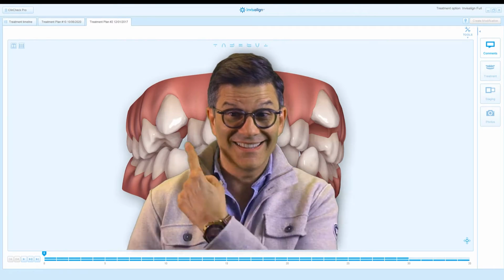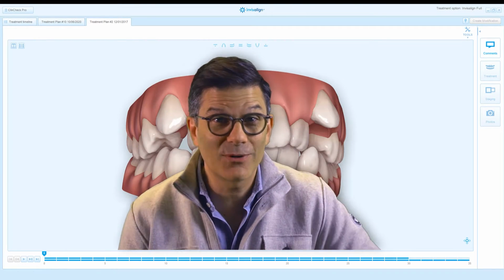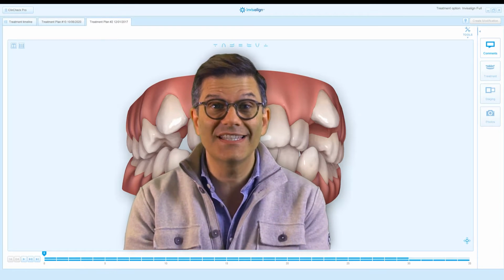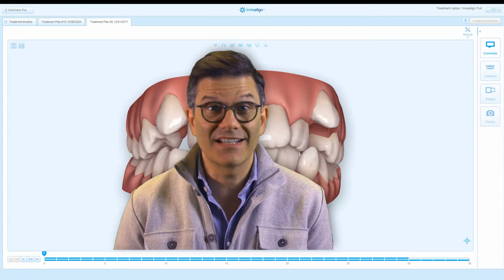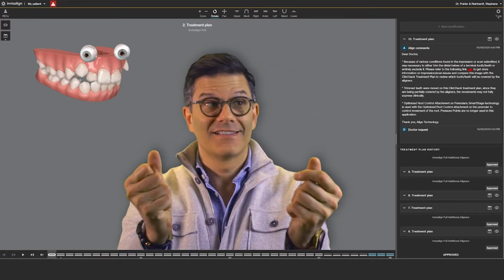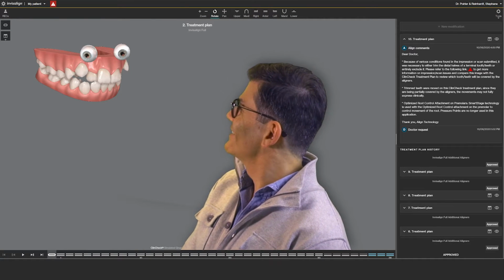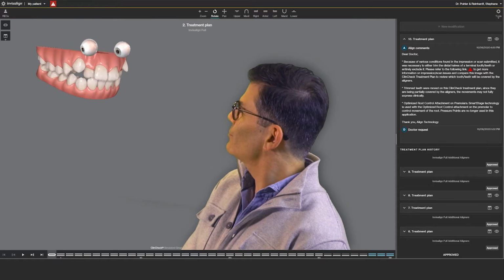This thing here, the ClinCheck 5.0, this gone, finished. You don't need that anymore. You will have the ClinCheck 6.0. Aren't you happy? You're always improving.